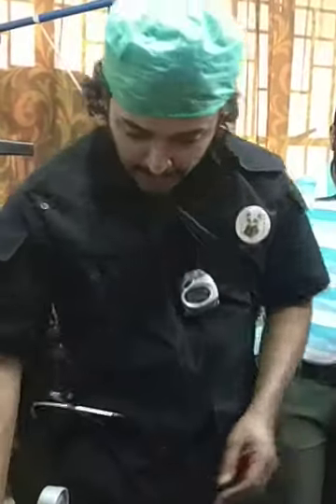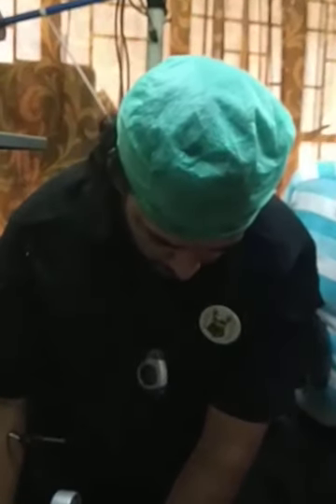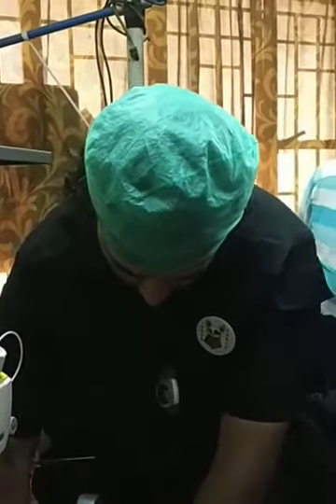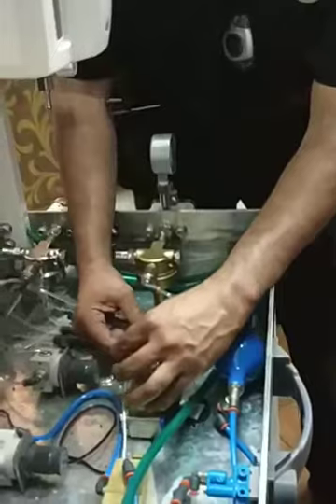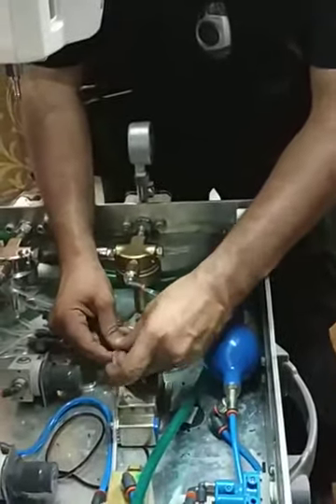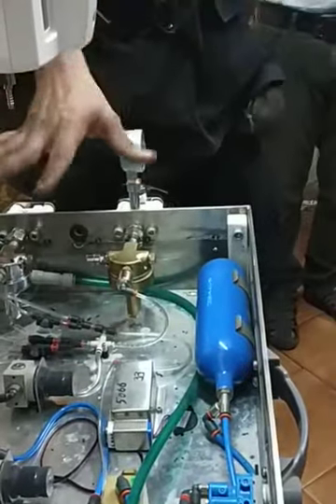And these pipes, and these are self-sealed. These valves are like this. Okay, so these tubes. Okay, so if something is not working, with the help of a technician, you can always see, and the more the connections, the more the leak test has to be done. You cannot use any oily, greasy things over here, okay, and these are very simple things, but again a normal person wouldn't mess with them, okay. These things are best left with the technician, and at least you should be able to know if there is a problem, whether it is safe or not.